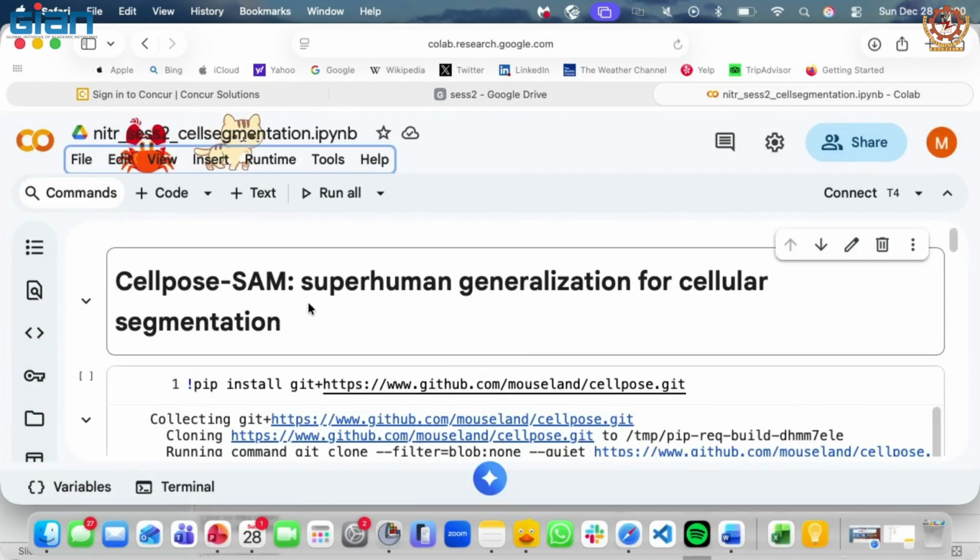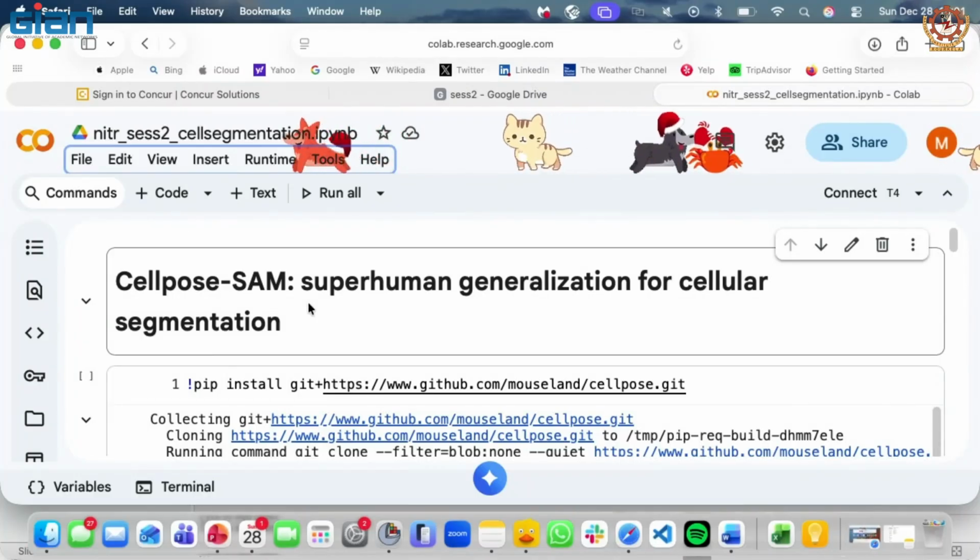In today's lecture, we saw how Dr. Prasanna showed some histopathology slices where you have the cells segmented. So we'll do a hands-on on how to actually segment the cells. I think somebody had a question, what's the difference between the normal whole slide image and the whole slide image with those green colors? So here we'll learn how to generate that.